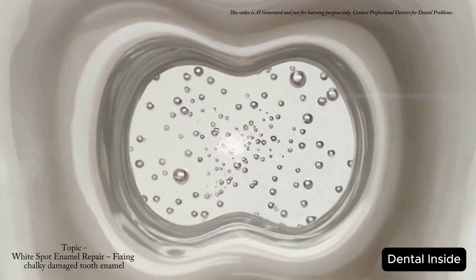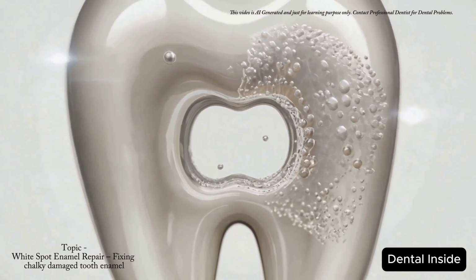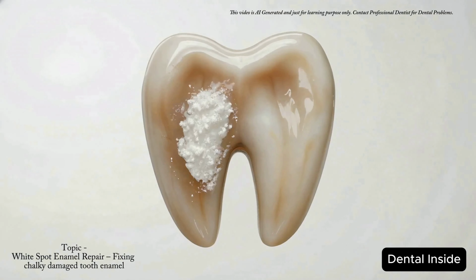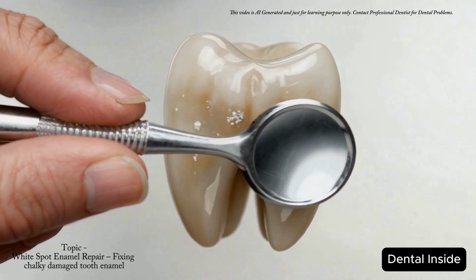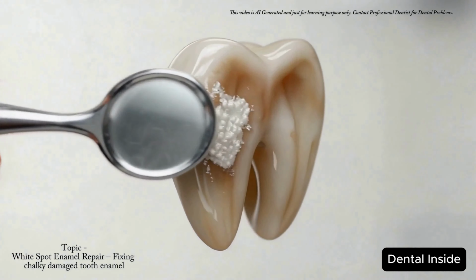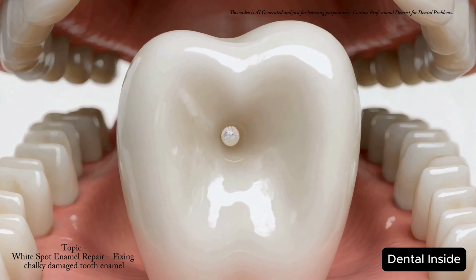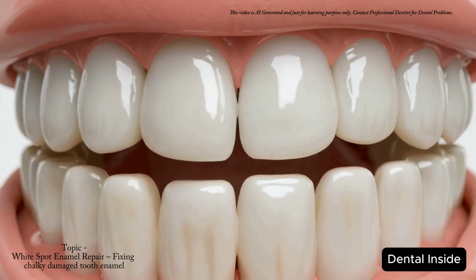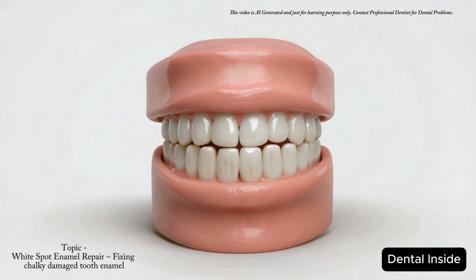Some early enamel changes may also benefit from professional guidance focused on supporting mineral balance and enamel health. The tooth is evaluated again to assess the result and determine whether any additional professional care may be appropriate. White spot appearance may improve with appropriate care, but results depend on the cause and condition of the enamel.